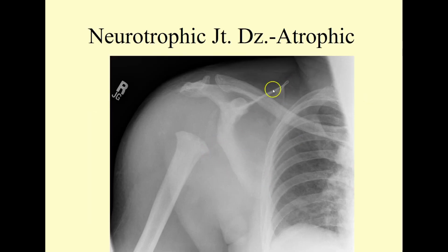Very good example. So here you've got obviously the scapula, what's left of the glenoid, where the humeral head should be. We just have apparently a space, and then here's that surgically amputated view. It's so neatly taken away. Also see a little bit of distractive injury at the acromioclavicular joint.